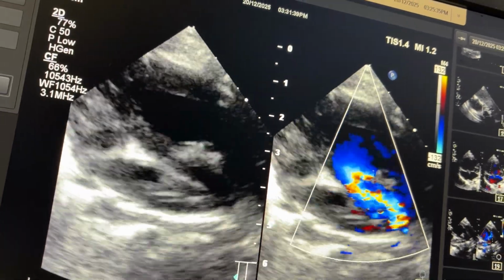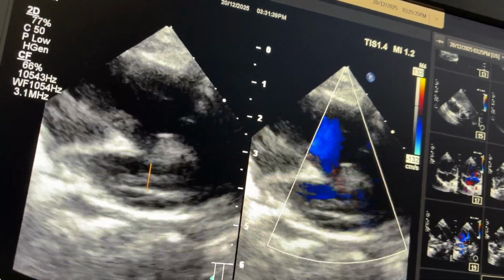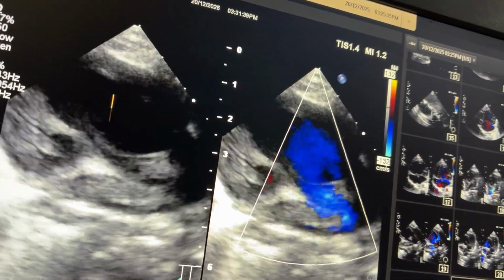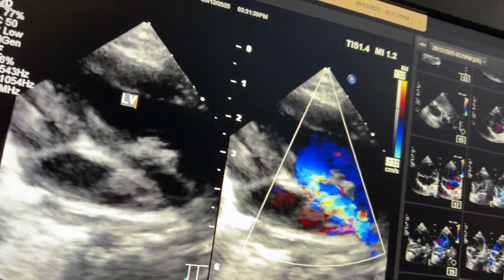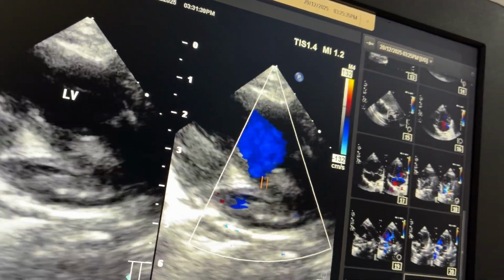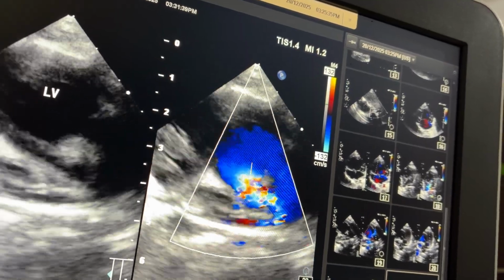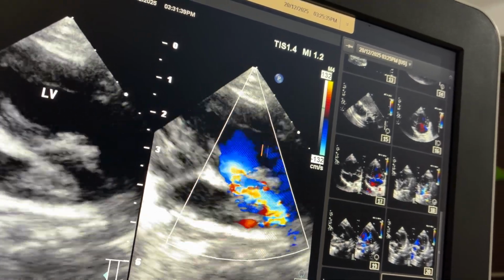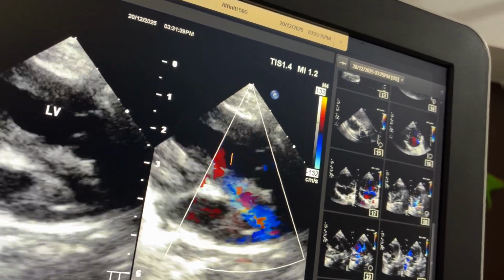Again you can see this is the right atrium, this is the right ventricle, and this is the left ventricle. Orientation-wise it is different. You can see this is the left ventricle, and the left ventricle is giving flow to the pulmonary artery and aorta both. Both are parallel in the initial part, indicating both are parallel related, but mainly both are coming from the left ventricle.